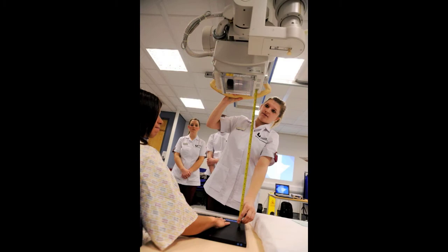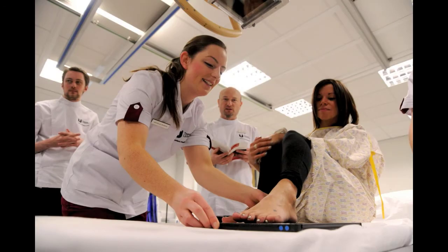The program leader tells us that implementing Projection VR alongside traditional skills lab tuition has allowed the individual students to have more experience before their first placement, but it's also reduced the timetable pressures on staff and skills lab. This worked because they reduced the hours each student spent in the skills lab from 12 to 9, but introduced a whole 9 additional hours of student time with Projection VR. Reducing the small groups saved 4 times 3 hours, i.e. 12 hours of staff and room time. 3 more than were added.